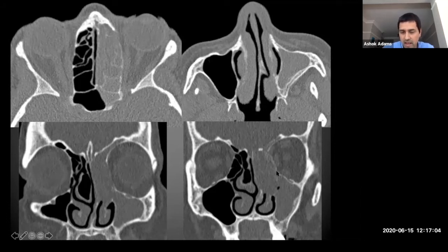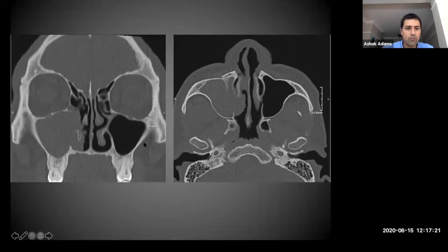So in this patient, again, similar to the other case, if we recap, that's the olfactory niche that I mentioned before. You've got the cribriform plate, lateral lamella, crista galli. So here, I can't really make out that cribriform plate, and that lateral lamella is definitely suspicious. That's gone. So that was, I'll show you when we go through the cases, an esthesioneuroblastoma.